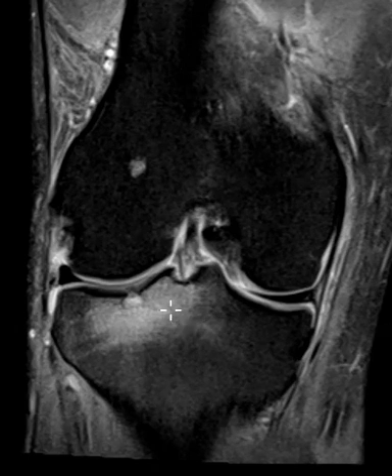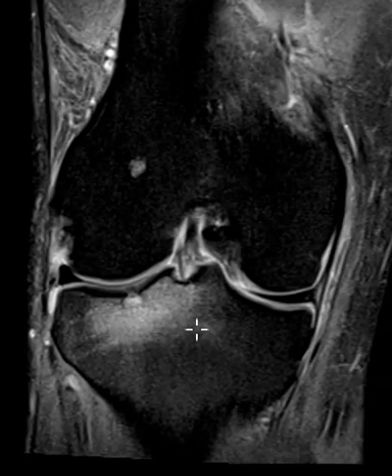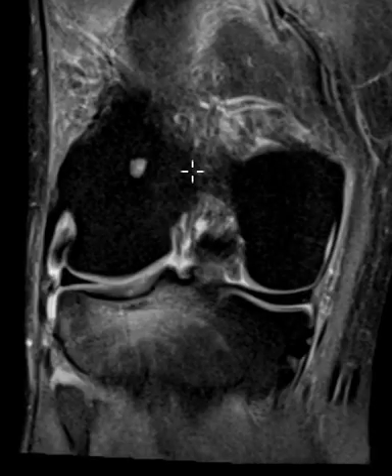But an interesting case of a small area of infection, osteomyelitis, with no history of drug abuse or any other risk factors, which is interesting. And this other little benign bone tumor here is called an enchondroma, of no clinical significance.